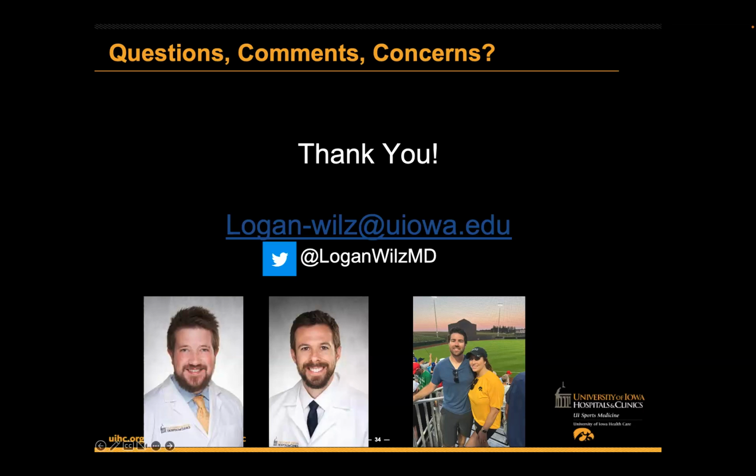All right, thanks, Logan. That was fantastic. Really great images there. I just have a couple of comments on the ankle scan. The ankle scan protocol is a great starting place, but certainly, the foot and ankle are really complex. And at least in my experience, there's oftentimes multiple different things going on at the same time, or at least multiple things that display pathologic findings. And so, as you had mentioned, it's important to correlate what we're seeing with what the patient is experiencing.